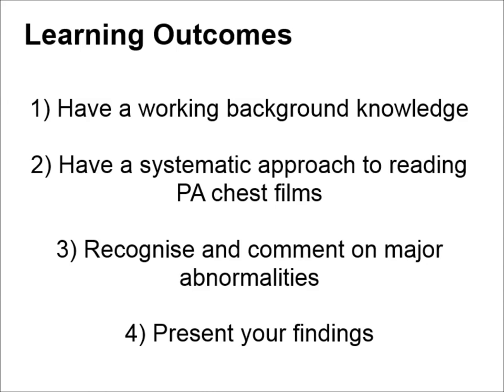As this video is teaching the skill of reading a chest X-ray, I will not cover the more advanced skill of how to diagnose particular chest pathologies. By the end of this video, I hope that you will: 1. Have a working background knowledge of the theory behind chest films. 2. Be able to use a systematic approach when reading a PA chest film. 3. Be able to recognise and comment on any major abnormalities. And 4. Be able to present your findings to a colleague in a coherent manner.